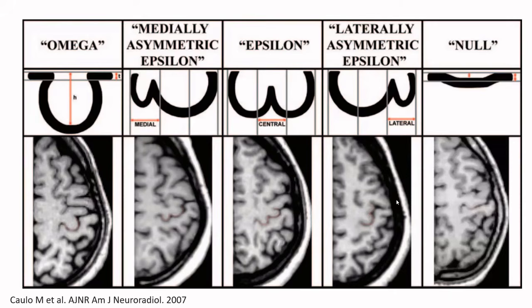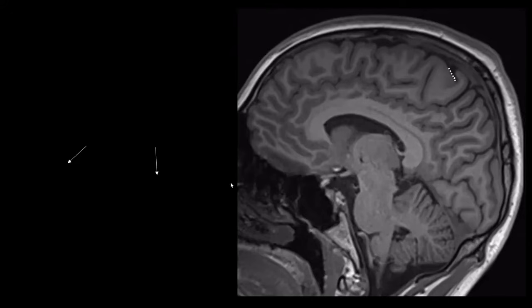And then in a minority of cases, we see no knob whatsoever. So a patient with no hand knob. That doesn't mean he doesn't have motor representations of the hand or arm, but it's not located in a knob like in these patients. So this is a second trick, and I often combine it with the T or L sign, which I find basically the easiest.